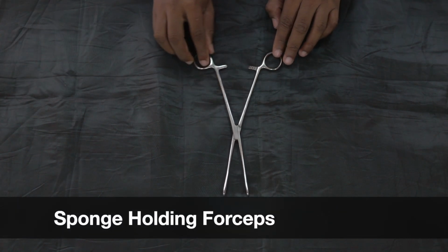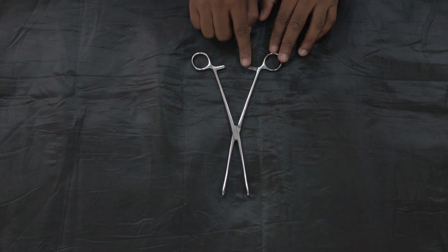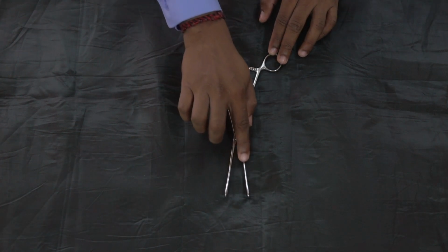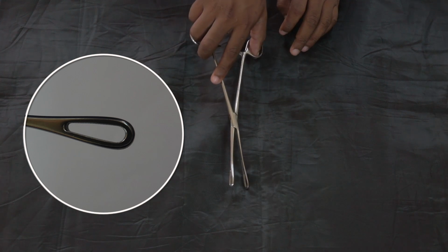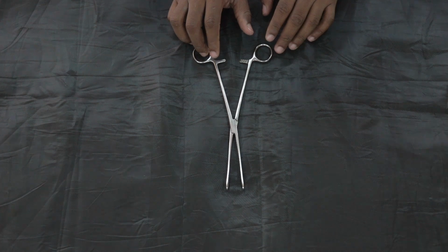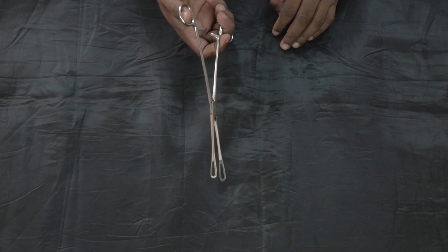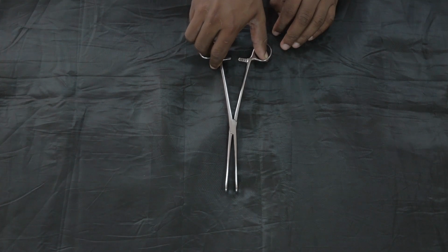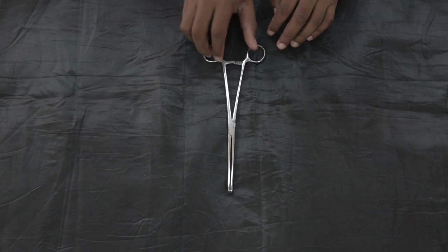This is called sponge holding forceps. It also has a handle with lock, straight shaft, and the jaw has a fenestration and is wider to hold the gauze swabs, and it is used to remove the retained products in the cervix and the uterus during the evacuation of retained products of conception.